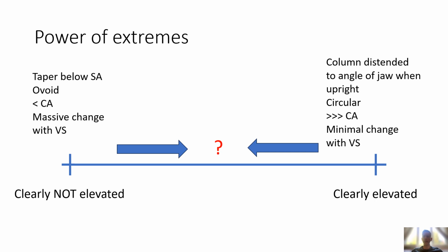Let's consolidate the different components of the internal jugular vein assessment for CVP. As discussed in the UBC-IM PoCUS screencast on the IVC, the power of the exam lies at the extremes. Recognizing that some of these data points do not function well as dichotomous variables, we need to exercise caution when making conclusions about these variables on the margins of a given threshold. Differentiating a very mild increase in CVP from a high normal CVP is likely not possible. As such, the power that these findings have to impact the clinical impression about a patient's volume status or right heart function depends on the significance of the findings.